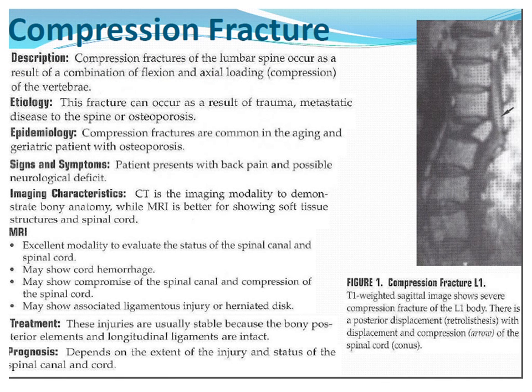Sometimes they're known at the time of the injury, and so you may be asked to do an MRI just to see if this was acute or if this was an old fracture, because on CT and on X-ray we rarely can tell if it's definitely acute. You won't always see really defined fracture lines like with our burst fracture and the C1 fracture. So what you'll see with MRI is that with an acute one you'll see bone marrow edema. With an older one you're not going to see any of that bone marrow edema, the T2 bright, T1 hypointense signal that you see with all acute fractures.